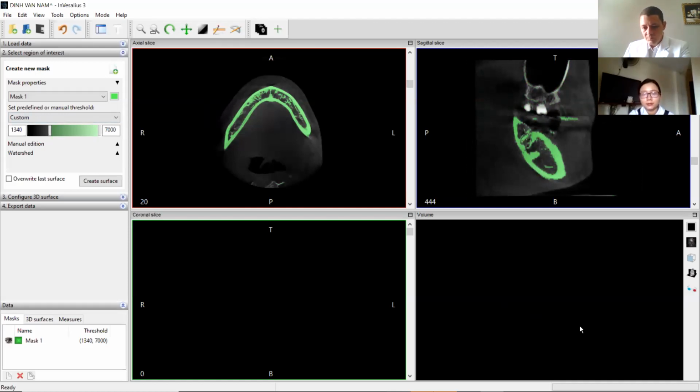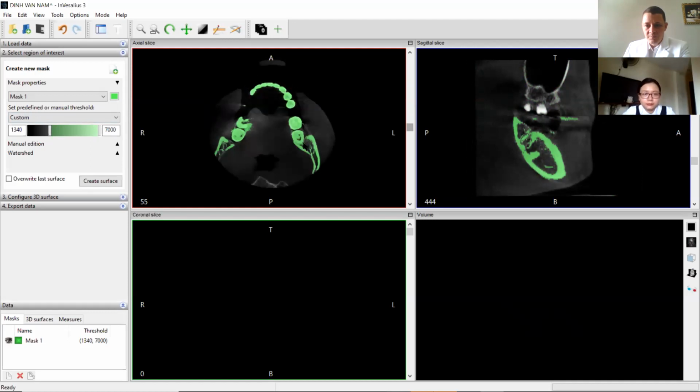Okay. Thank you. And here you see that all the parts that were outside have been deselected. See, here it's not selected anymore.